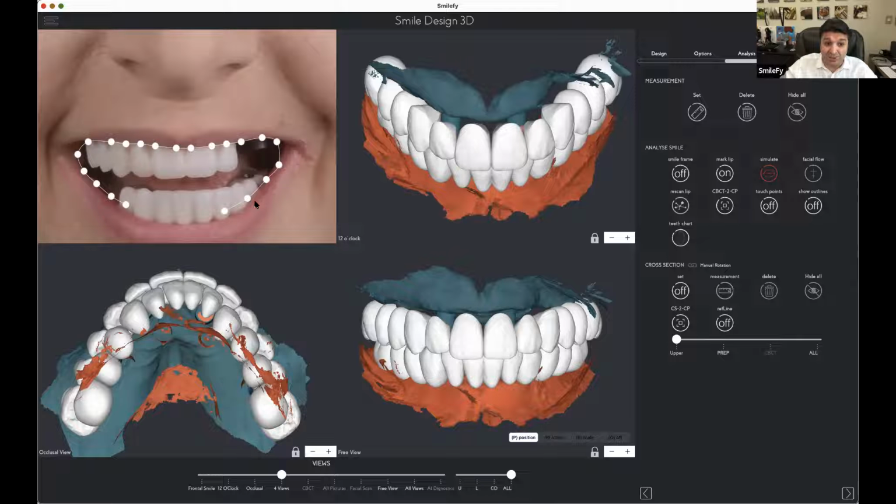So in the picture, we're gonna display the lower jaw in the position of the picture, and not in the centric occlusion, because that's something that I just realized, and it's much more useful, right, to have the picture with the jaw position of the picture and not in the centric occlusion. And then we have here the centric occlusion, and here we have the jaw position of the picture.